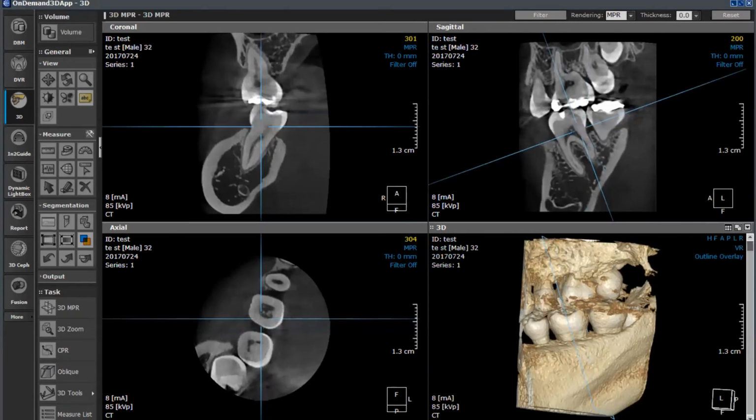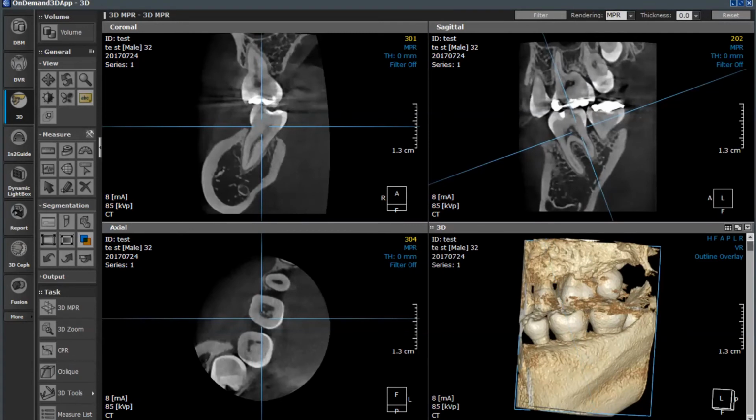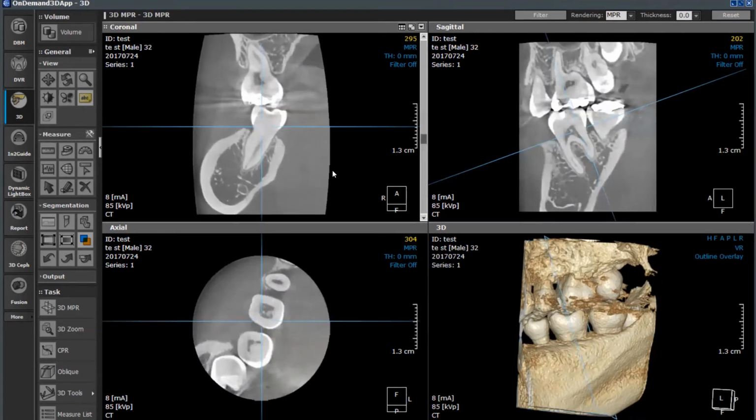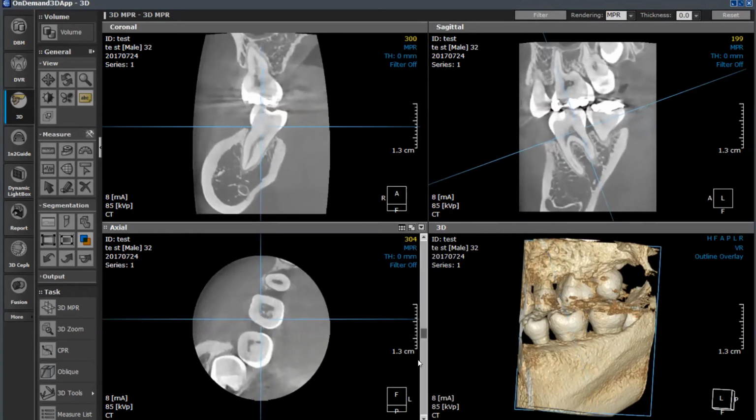Now, a lot of times in free field of view, sometimes it's important that I can also do what's called auto windowing. So a lot of times with free field of view, it may come out a little bit darker. This will help to brighten it somewhat, so you can get a little bit more detail, a little bit more contrast. But again, this gives you the ability to get that higher contrast along the way.